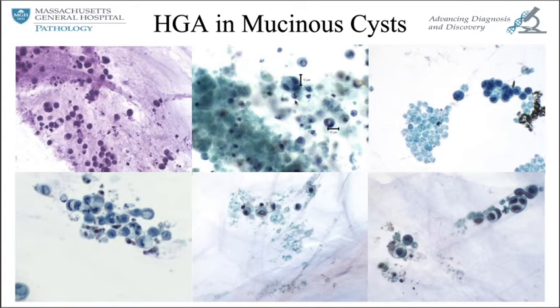If you were not comfortable putting it in the neoplastic, well, let me back up. You should be comfortable at least putting it in the neoplastic category. One of the benefits of the neoplastic other category is that it is a category for all grades, and you can still classify it as a neoplasm without necessarily saying it's high grade. So you're not putting it into a nondescript, non-neoplastic category such as generic atypia. You're saying this is a neoplasm, but I'm not 100% comfortable grading it based on the quality and the quantity of the cells. Does that make sense? Totally makes sense.